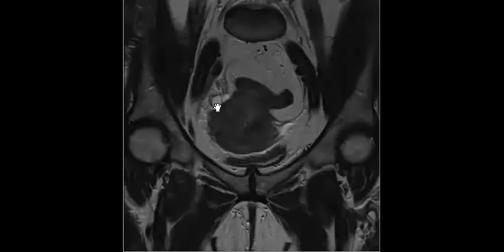Yeah, this case also has a coronal image. I will show you. It can help you see the right parametrial extension. Let me check if there are any more questions for the MCQ.